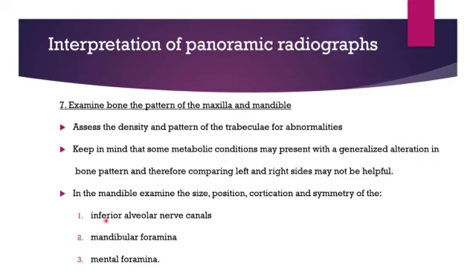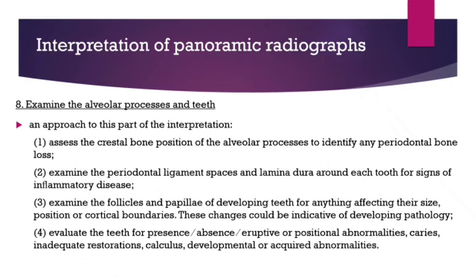Then in the mandible, examine the size, position, cortication and symmetry of the inferior alveolar nerve canal, mandibular foramen as well as the mental foramen. Next, the alveolar process and the teeth have to be examined.